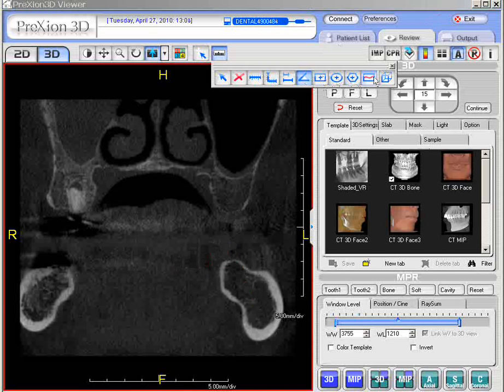These next four icons are really used for looking at the density of tissue over a specific area that is selected. One can select either an ellipse, and if you click this, well, this is the ellipse, I'm sorry, and then this is basically going to be your rectangle. So let's just demonstrate this very quickly.